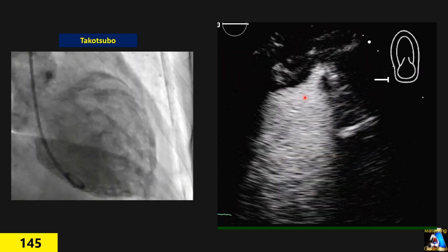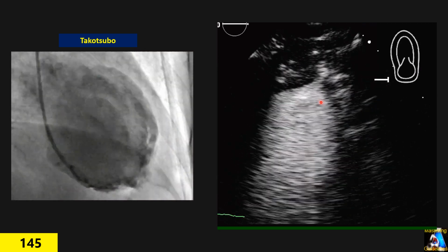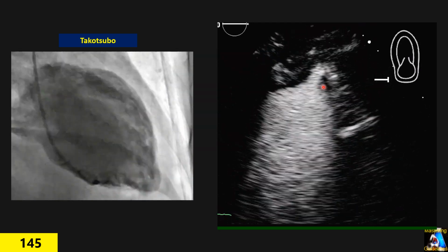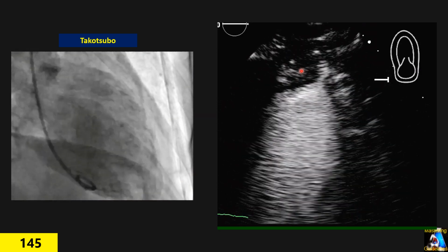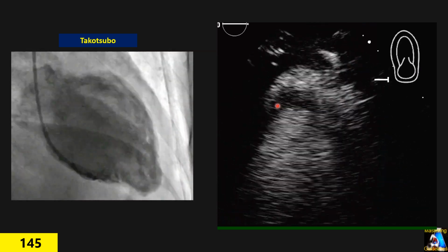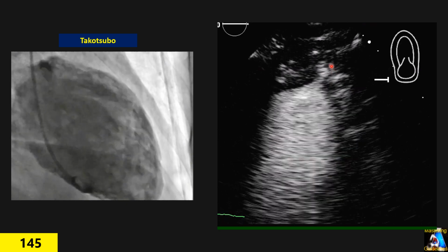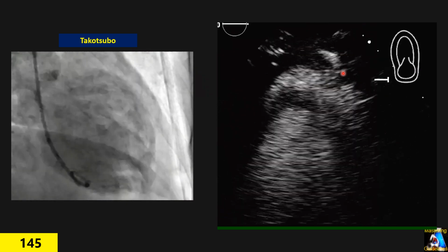Shortly I'm going to explain this with the contrast 2D on the transthoracic echo. As you can see, the myocardium close to the apex suddenly separates and ruptures. It's very simple and easy. You can see the contrast go beyond the myocardium. This is your myocardium, and the contrast goes here, not only this area, a little higher too. We can appreciate that most probably there is some blood clot forming and fibrin starting to form at this level.